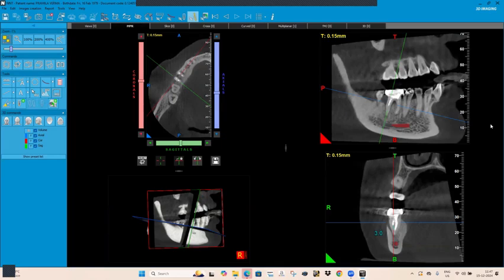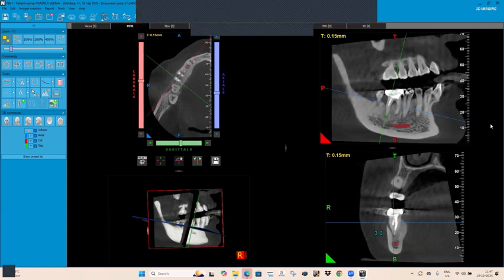No, madam, that is not available. That tool is not available in this. For NNT it's not available. I guess it's only for the volume of the airway spaces we can do. Only airway spaces. That is true.